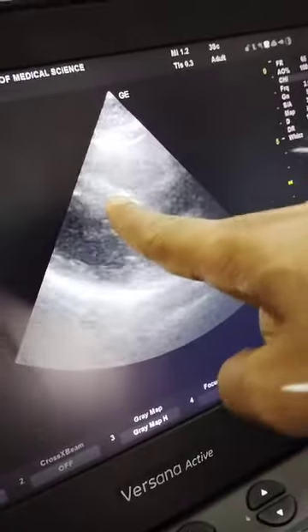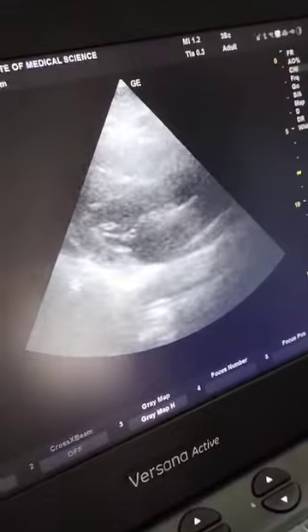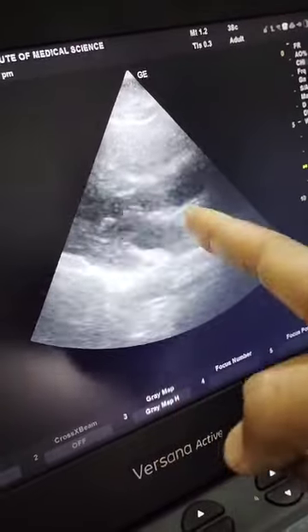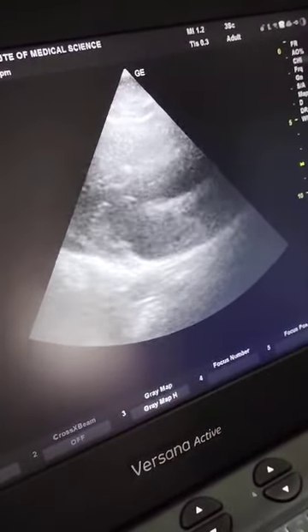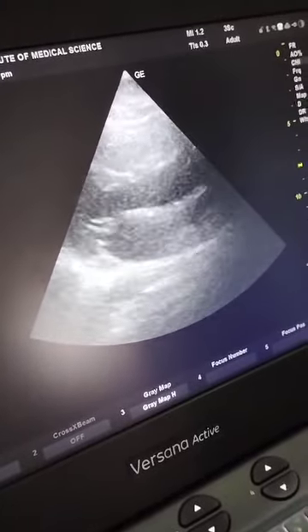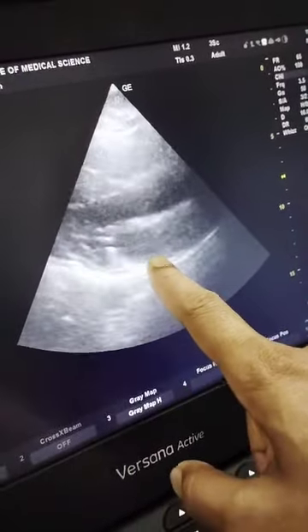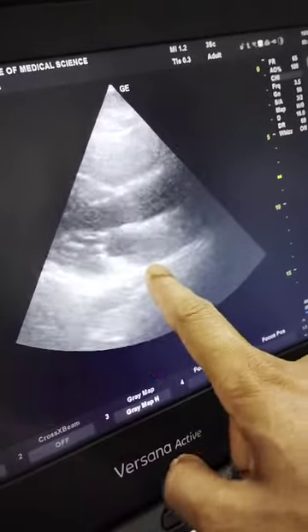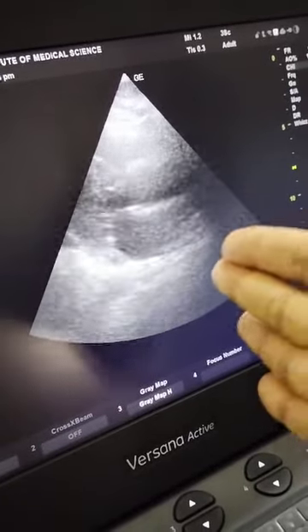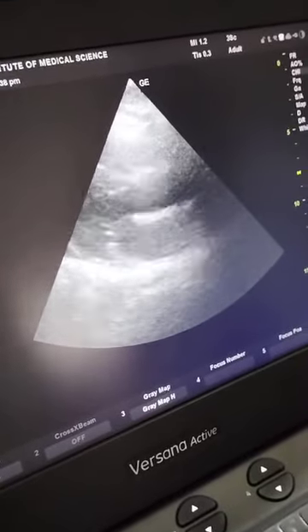Right. Ventricular hypertrophy is quite characteristic here, but you have to get the aorta. And you can see this movement, this one. So when it contracts and there's a systole, this is supposed to go there but not supposed to go anteriorly. And then it's supposed to come back quickly. That quickly coming back is not happening and it's going a bit anteriorly. That is what we are imagining or seeing or whatever.